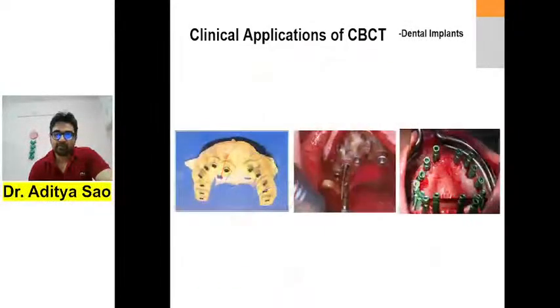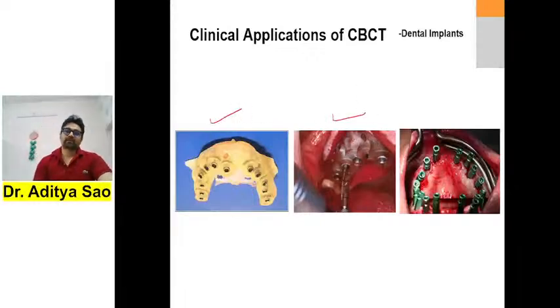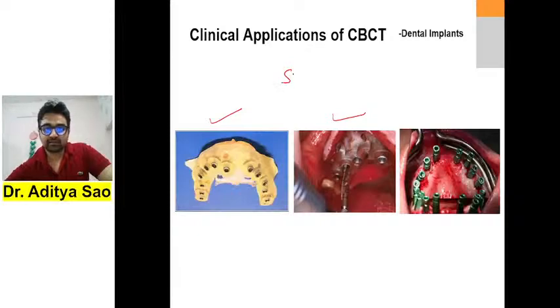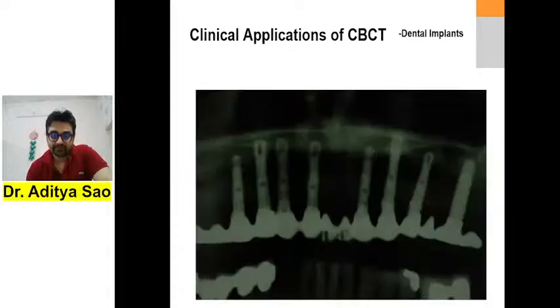Again, important visuals. What is this? This is a surgical template. Very important visual. This is a surgical template.